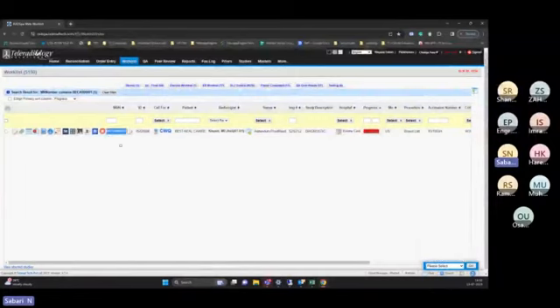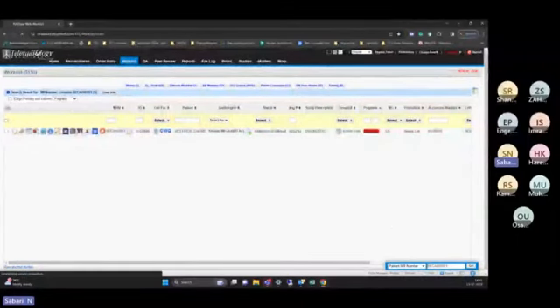So what happens if I search the same patient from the bottom search, this is called a bottom search, with the medical record number? If I click on search, wherever the scan is available, everything it will get. See, when we searched in the work list, we are able to see only one order, because it will search only in the work list.